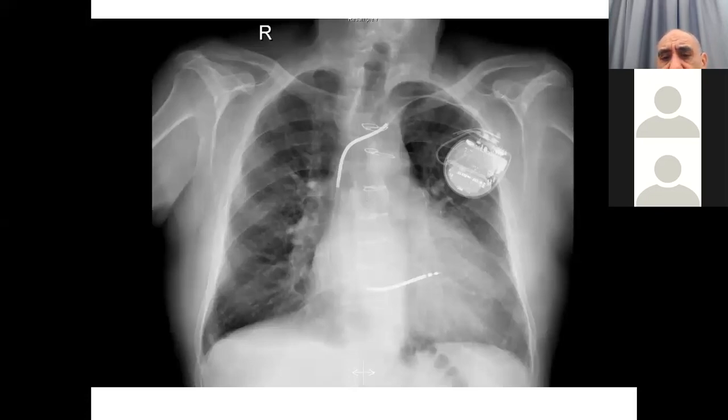The first procedure was coronary artery bypass. Then he underwent a defibrillator, and we said this is a defibrillator because of the thick lead. And in the middle, you can appreciate there is a mesh work of the TAVI prosthesis. And this is a closer look, a zoomed view at the center of the chest, where you can find the sternotomy wire, and this inverted bottle sign of a TAVI prosthesis.